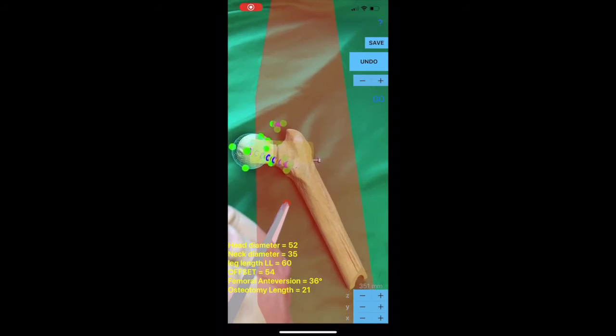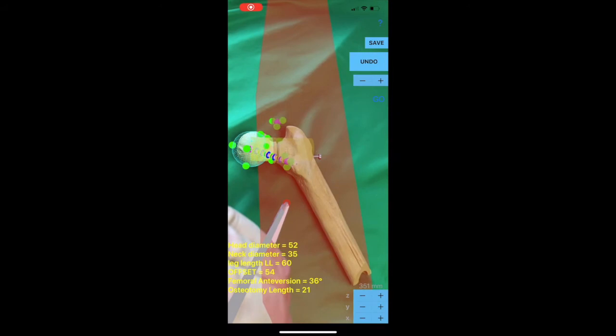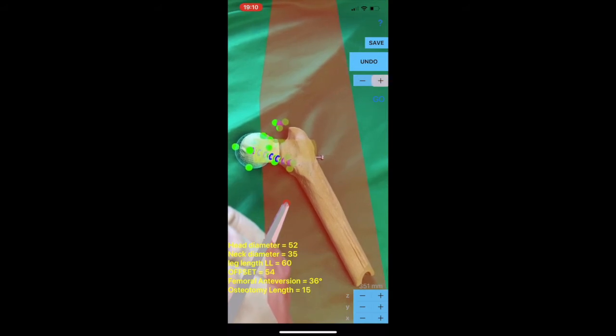The alternating colors are helpful and act as a ruler in augmented reality. Each color represents a certain distance in mm. The interval between 2 overhanging blue discs corresponds to an actual 10 mm distance, between a blue and a green disc 5 mm, and between smaller discs in tandem fashion of different colors 1 mm respectively.